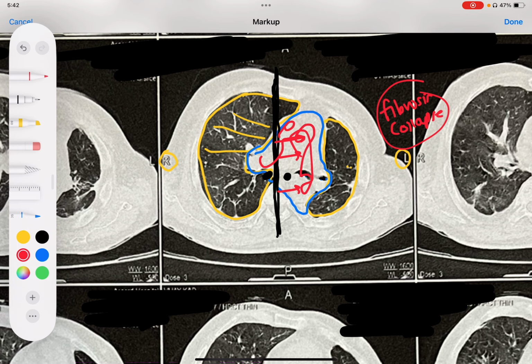This all is heart only, except this, which is trachea. So this is pulling the trachea, pulling the mediastinum toward the left side. Whereas what structures push the mediastinum is pleural effusion. So pleural effusion will be around the costal margin. We are not seeing a single drop of pleural effusion, or a tumor or a mass. So there is no mass.